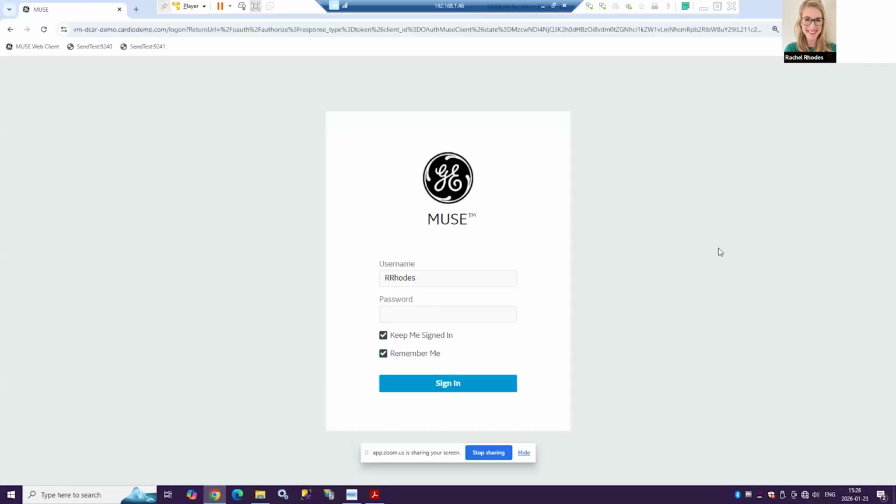Now, this is where I will log in. And when we're using the Active Directory, that means we link to our hospital Windows logon password. So there isn't an extra one to remember. It's also quite nice to touch on if you're finding you are getting a number of tests locked out. We do have an auto log out function on here, and that's set at the time of implementation. But you can always look to see, can we reduce that if you're finding that's something that you want to change. We can then sign in down at the bottom.